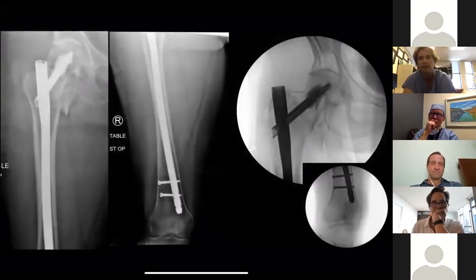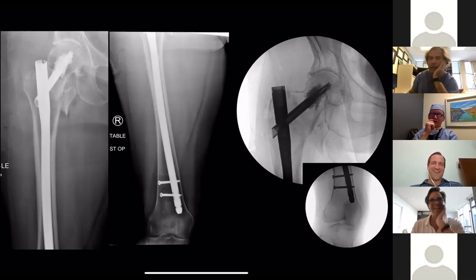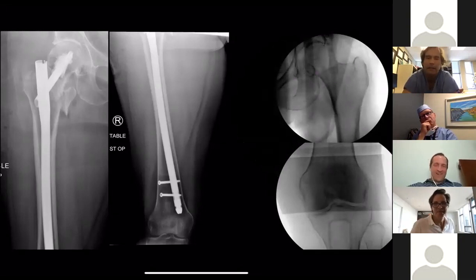So this is the post-op X-ray, AP. Now it looks like the proximal fragment is externally rotated compared to a pure AP of the knee, based on the contralateral side, right? And if you look at the intraoperative films, it looks like you've got internal rotation of the limb in order to get the AP X-ray that you needed. Interesting. Interesting in a you-suck kind of way. But look at this and compare it to the contralateral side, you can see it's different. Something's wrong, right?